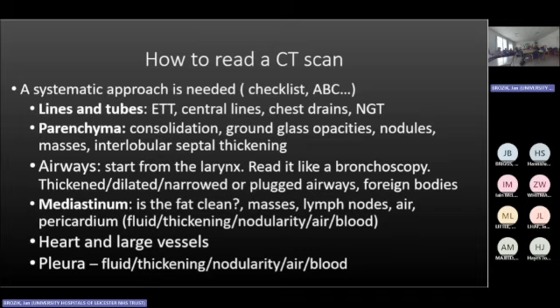You start from the larynx and you go down to the airways, and you are looking for abnormality, and we see exactly the same thing as you do when you do bronchoscopy, but the blood on our images is not red. I think that's the main difference. Sputum is not green, everything is gray.